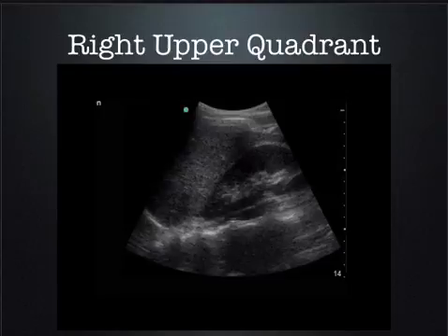Is it positive or negative? The answer is always on the screen, or you can follow the lecture. These are all positive. So what do you think? Is it positive? Yes. Where's the fluid? Is it right there? That's the fluid, right? No? Is that not the fluid? All right, that's the vein. Remember that the IVC runs posterior to the liver and the hepatic vein runs right into it, so those are not what we're looking at.